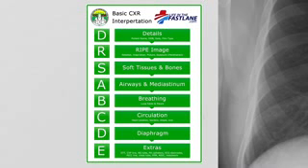I learned when I was in medical school and internship something called ABCDE, and I'm going to use this one here that comes from Life in the Fast Lane. This is a website. There's a lot of great educational material. I believe these guys are out of England or Australia. And they added the word doctors to the front. DRS, so doctors, A, B, C, D, E. And so you can see it's details, it's a ripe image, soft tissues and bones, airways and mediastinum, breathing, circulation, diaphragms, and extras. And so we'll go through each one of these in turn.